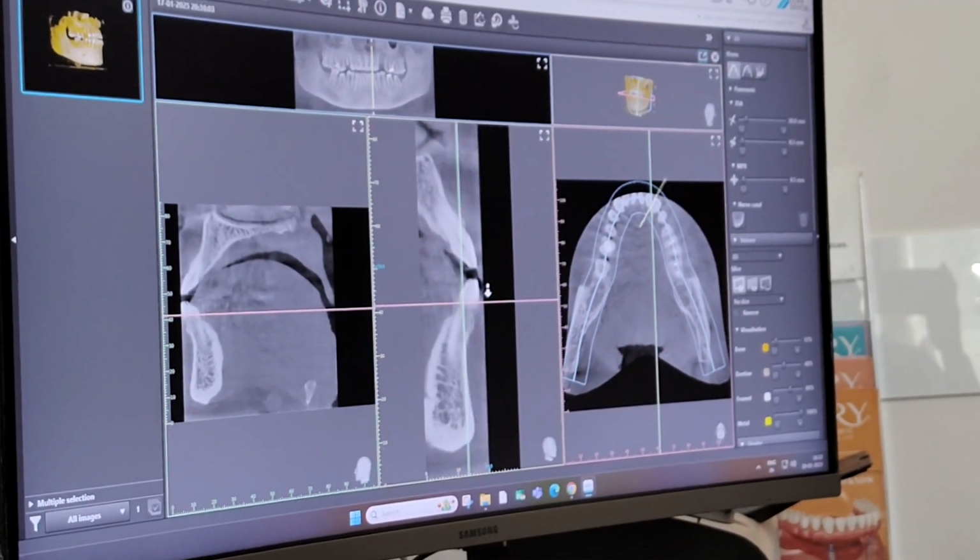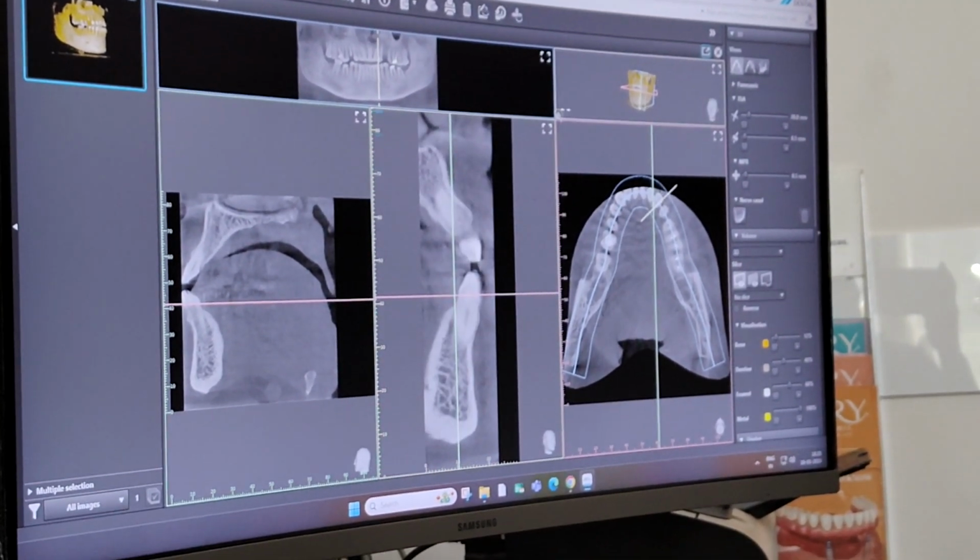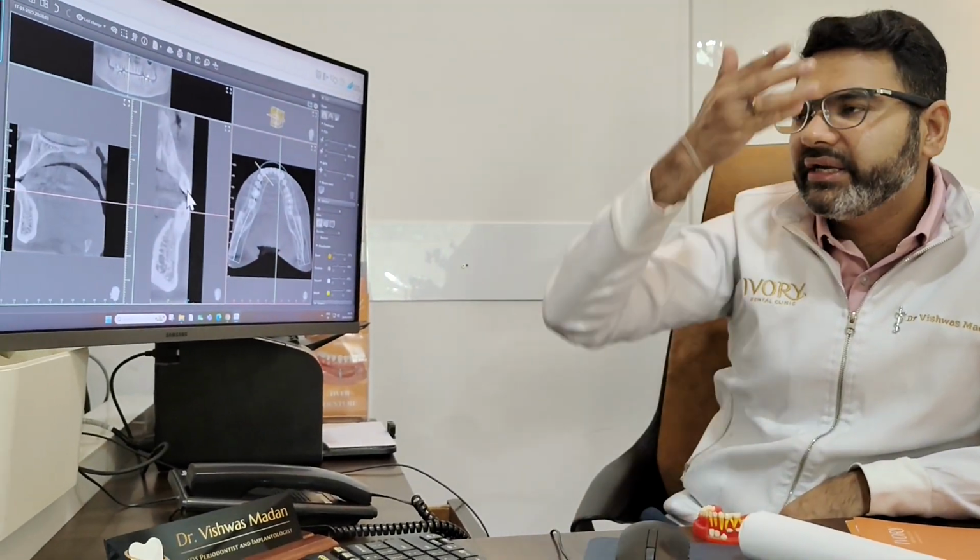section. Now we also have the option of the coronal plane. So coronal plane is basically we are cutting it from the middle like this. So like this we are cutting and we are going behind. Okay. So sagittal plane was in the middle. Coronal plane is we are cutting it from the front and going back.